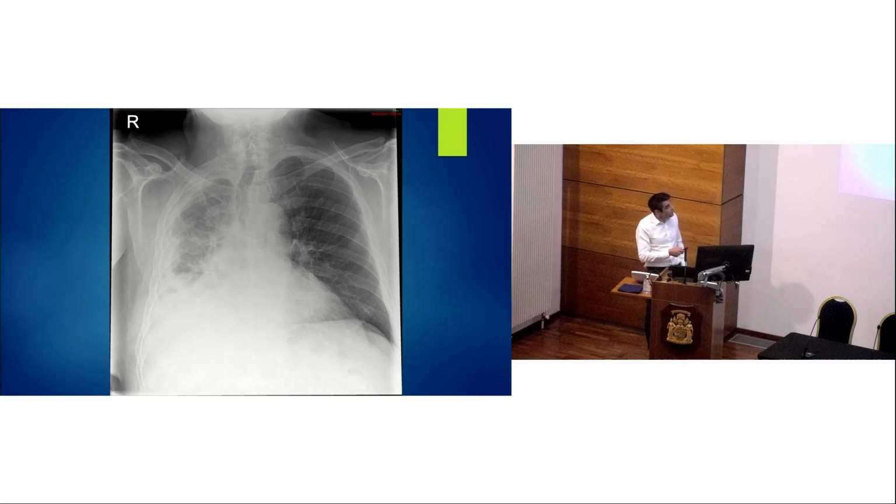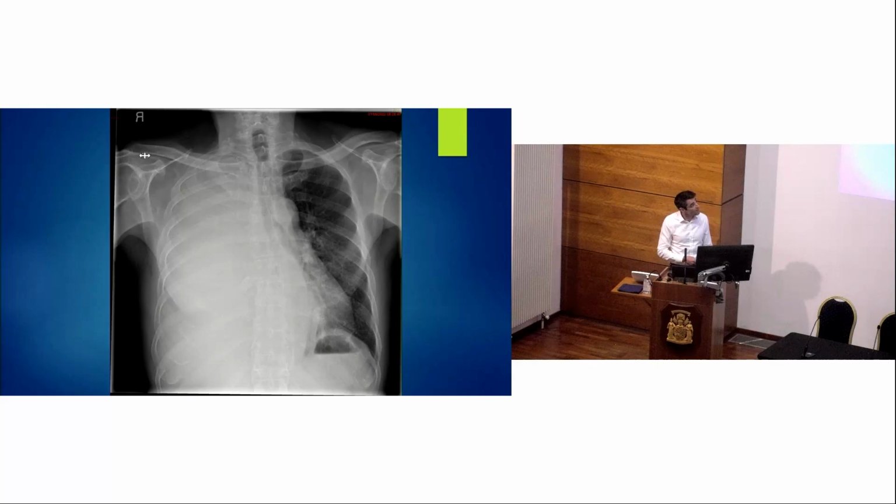Here's another example, but on the right side this time, so normal left lung, a rind of abnormal opacity circumferentially around the lung, contracting that lung. So this is the classic appearance of meso on a chest X-ray. But as I say, late disease, and we want to be diagnosing it earlier than that with CT and so on. Here's another example of, this time, a massive pleural effusion.